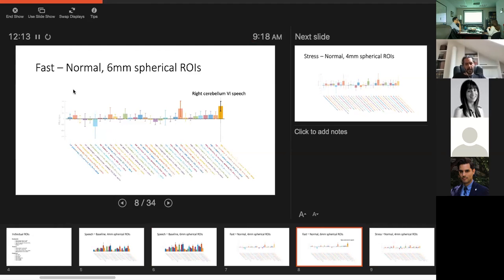And what is the other region that is close to significant as well? The one that probably shows significance uncorrected but not FDR corrected. Right, it's the right thalamus. Yep. That's interesting, that actually does pop up. And I think that comes up again later in another contrast.